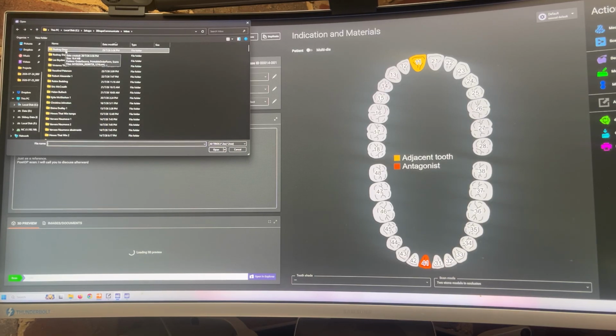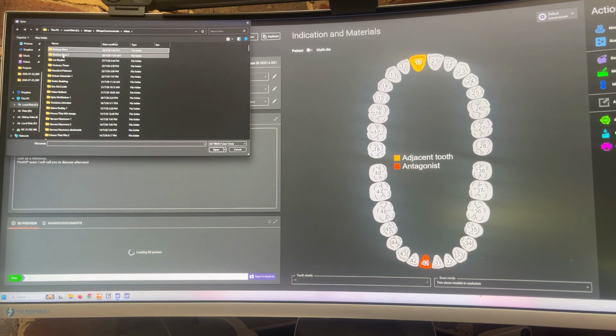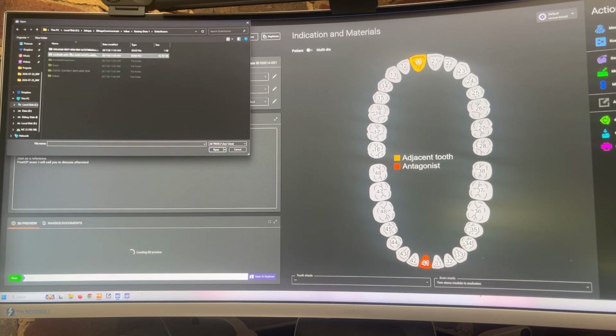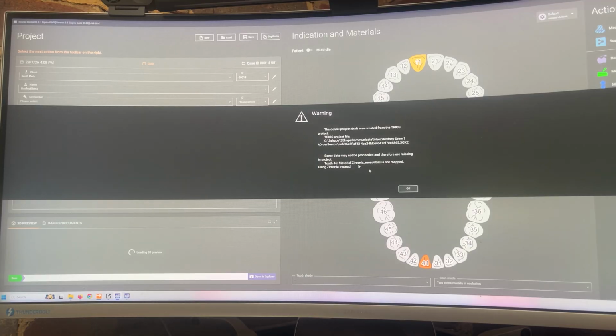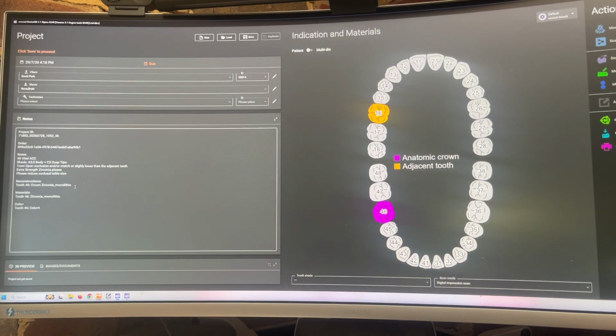So this one, this is Scott's patient. Is that it? No. This one here. Yeah. All right. So you can treat this page like, I guess, the lab slip.